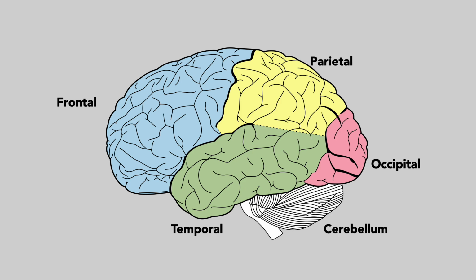Some people like to be all classy and say, well, we actually have a fifth cerebral lobe. It's called the insula. It's a section of gray matter embedded within the brain. You can reach it by opening the Sylvian fissure, which is right here, and looking deep, you'll find some gray matter. This is the insula.